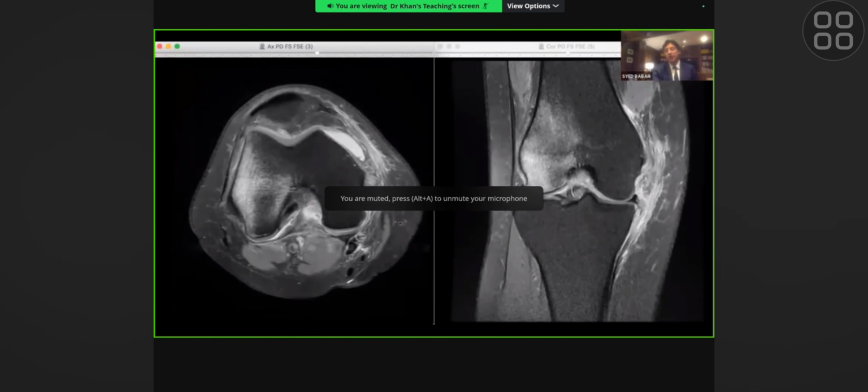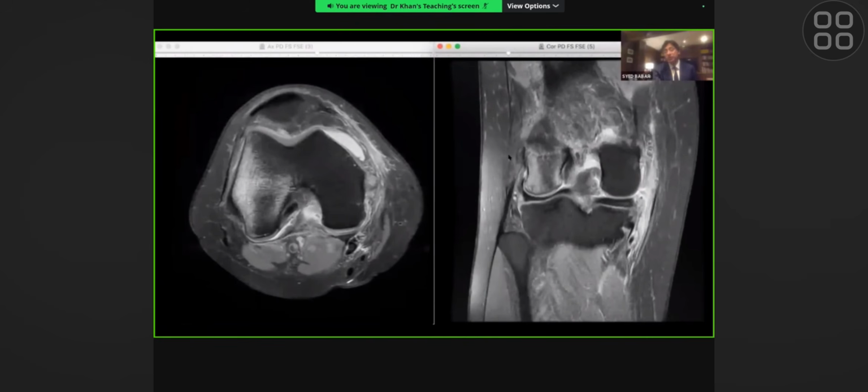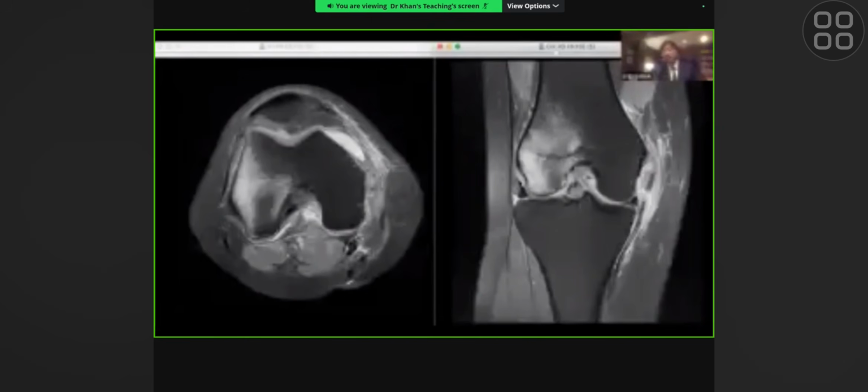you will have lots of bone bruising here, very little bone bruising here, but you will disrupt the biceps femoris and the lateral collateral. And the typical mechanism is that the biceps femoris avulses from here because the lateral side of the knee opens up. So it's exactly the opposite of what you're looking at if the force was to come from the medial side.